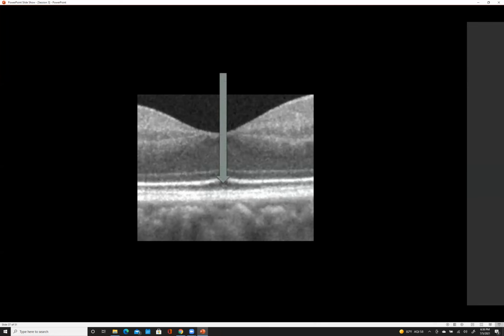So I think we're pointing to the myoid layer there, which is the... Everyone does that, and I always laugh. I go, reassess. Oh, outer. No, sorry, it's the outer segment. Photoreceptors. I have to tell you, 90% of the time that's what people say, the myoid layer. They think, oh, I got that dark one that I didn't know what it was. So they say myoid layer, but you know what this is. You just told me it's the outer segments of the photoreceptors. You got it. Okay. How about that?